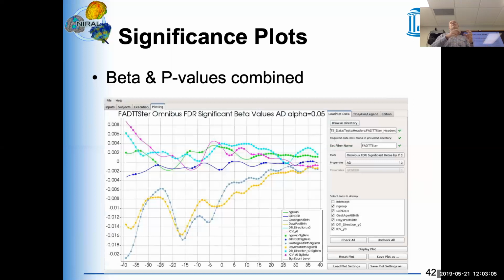If you run, let's say, 4 versions of DTIAtlasFiberAnalyzer, one doing one tract, another one doing another, they shouldn't write into the same output folder. If they do so, they can be mixed up. But you can run as many in parallel as you want, as long as the output folder is different.